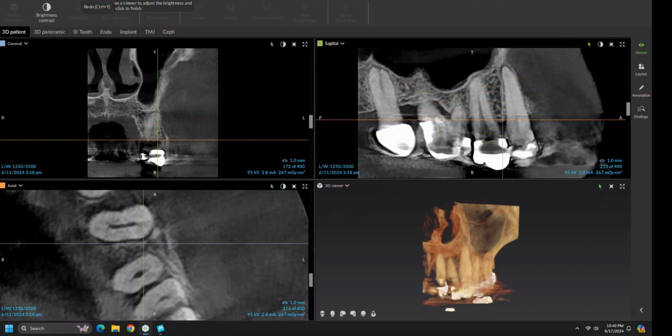Hey Doc, it's Nick. We have a patient here that you had obtained a CAT scan for, and we want to take a look at this together just to confirm what I believe a periodontist had recommended an extraction for. So the tooth is number 12.